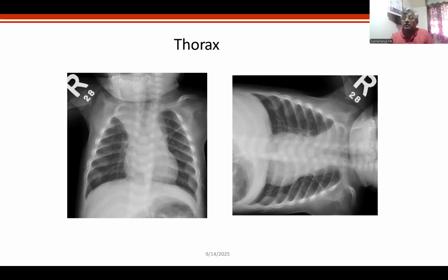But you look at what is happening here. There is a bulbous end. What was the problem here? The problem here was that we were not looking at the complete chest film. Look here, it should go up to the skeleton. When you distort the film like this, then you can see better. Whenever we see a film like this, we see cardia, lungs, correct? We are often drawn to that.